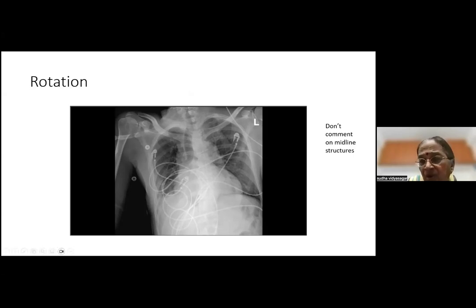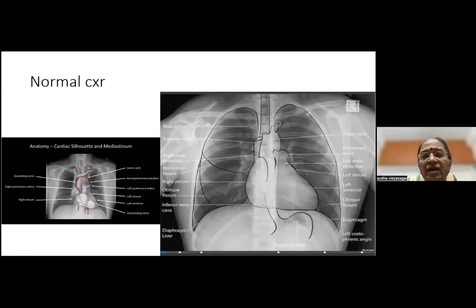And now let's go on to, this is probably the last X-ray that I'm going to talk about, some general things. You can see the normal chest X-ray, what all it images. That's the lung there, and this is the heart here. And as you can see, the most common mistake made is that this shadow of the heart is interpreted as right ventricle. Remember, the ventricle is here. That is the ventricle, okay?